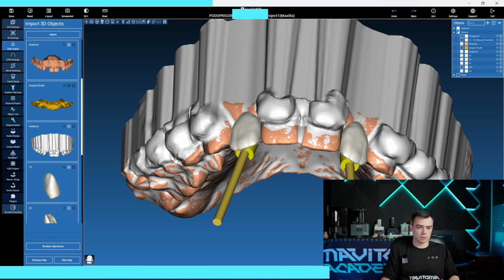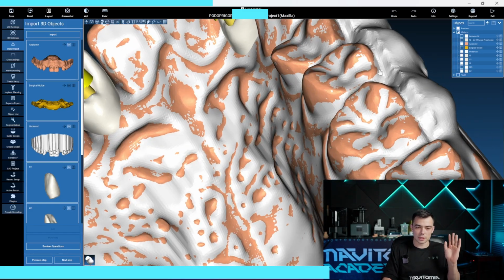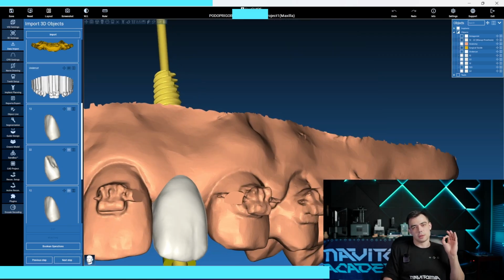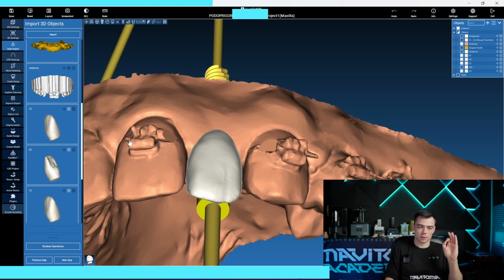a security zone. This security zone was not taken from some kind of scientific reports or literature or so on. That's our own name, so you can name it as well. What is the main idea? The main idea is very simple: when we see stuff made of metal like braces, we actually don't know the exact shape. Even with the spray, we actually don't know the exact shape of the metal pieces of braces, and we keep in mind that there is the probability that the shape of these particles is different.